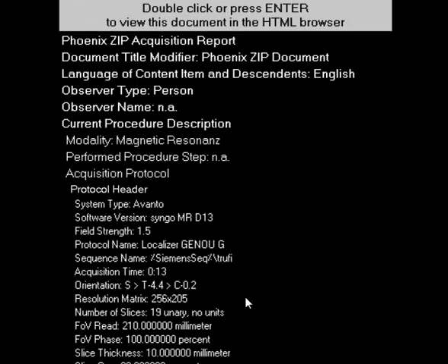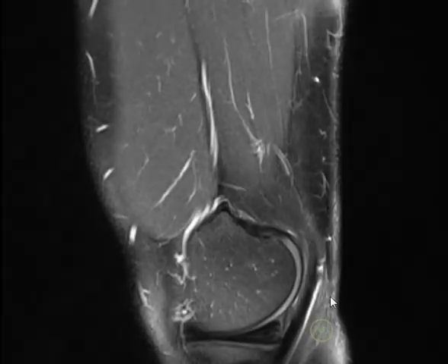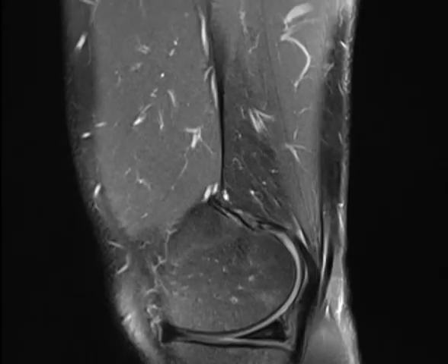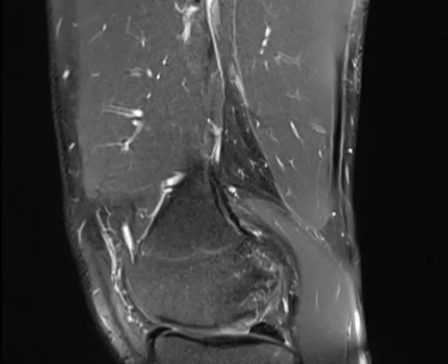This case is of a 20-year-old male patient presented with long-standing swelling around the knee joint, and it is recently starting to increase in size with a little bit of pain. That's the full history. So MRI was requested. It's not difficult, but needs a little bit of attention. It's not very rare. No history of trauma. No trauma.